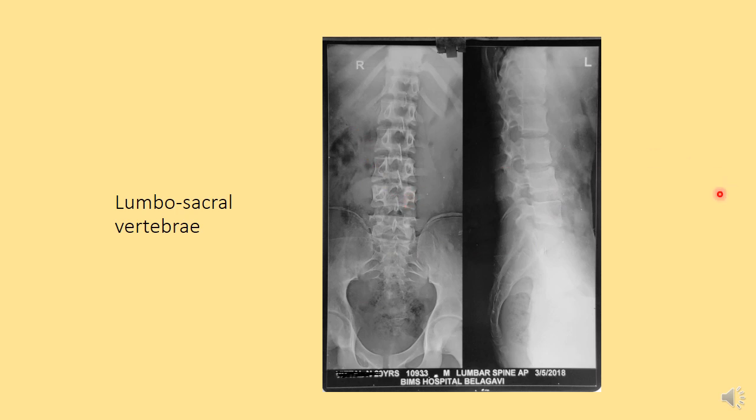If the same exposure is widened on either side and the whole of the pelvis is exposed and the areas of the kidneys have been exposed, such X-rays are also called KUB, kidney, ureter and bladder. If there are any radio-opaque stones present in the calyces of the kidney or in the ureter or in the bladder, such calculi can be picked up by radiographs if they are radio-opaque.